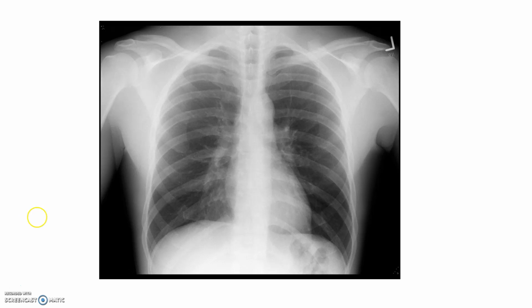I'm going to start off by documenting that this is the right scapula. This is the left scapula. This is a marker that helps me differentiate between left and right side. I would probably move the marker off of the anatomy.